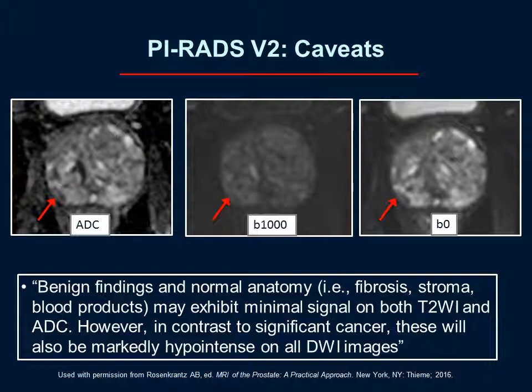As an example, this lesion has decreased ADC, but when we look at the B1000 image, it's actually not bright, but dark. So then to explore further, we go back to the initial B0 image, and we see it's dark there as well. So this is just a signal poor region. It's dark in all the Bs. It'll be dark on the ADC. And this doesn't really reflect restricted diffusion, but just other benign processes causing essentially a T2 blackout type effect.